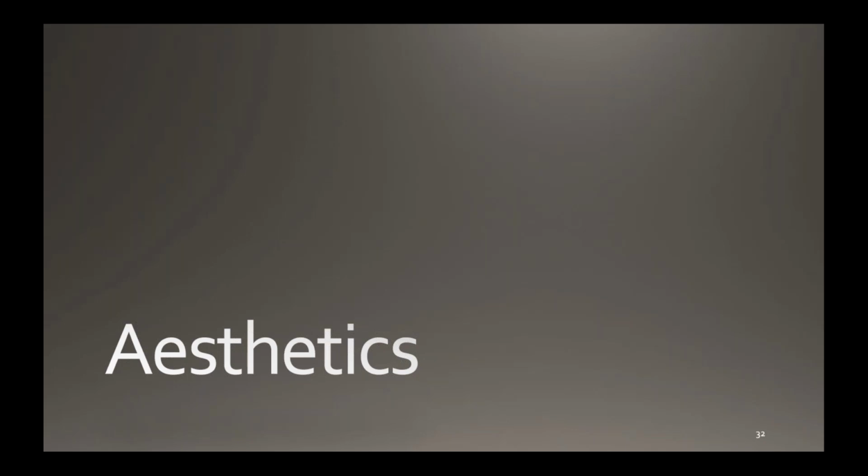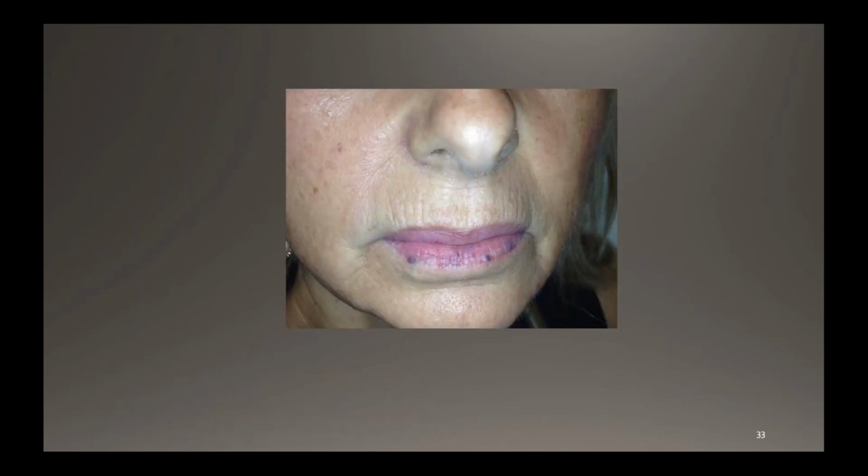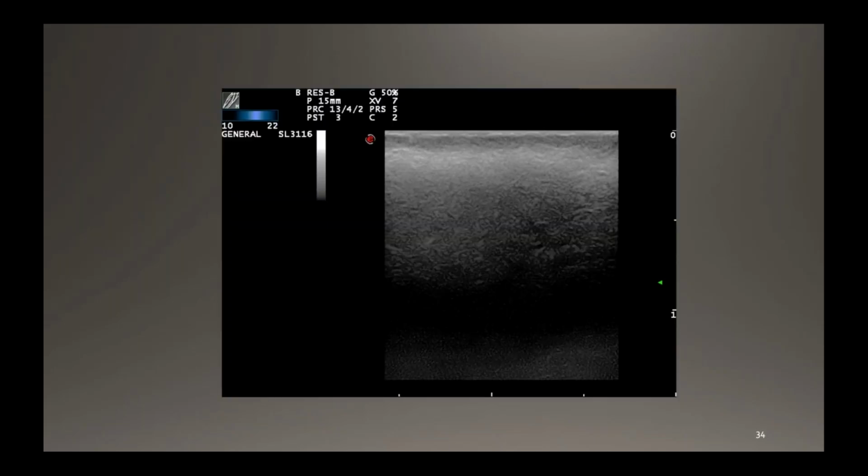In our outpatient clinics, we are starting to see patients coming with problems after the infiltration of this kind of dermal fillers that you will see are not dermal fillers really. They are subcutaneous fillers. This is a case that came to our clinics. The patient came regarding these venous lesions in the lower lip, and she wanted them to be removed with lasers. When we explored her, we saw this image.